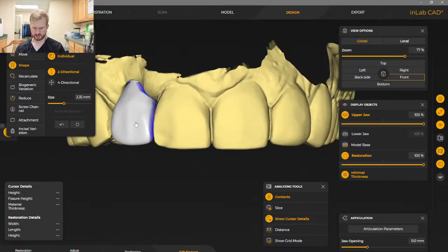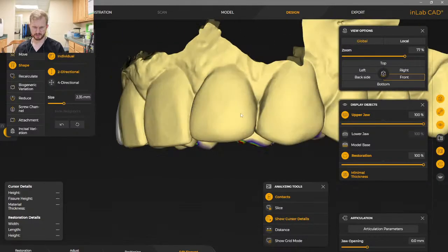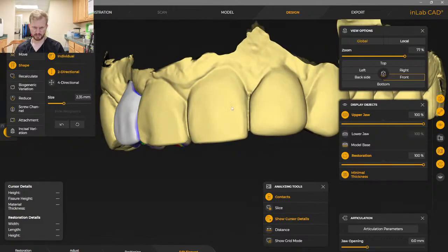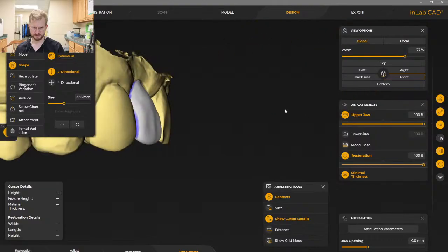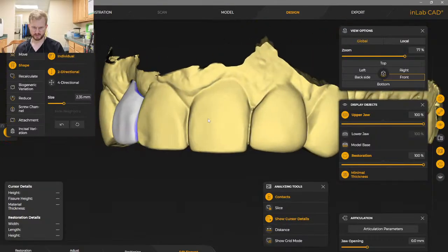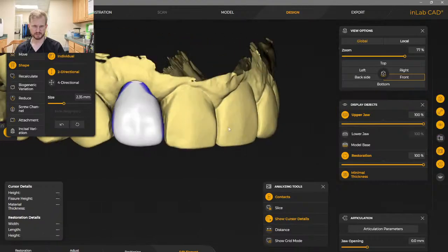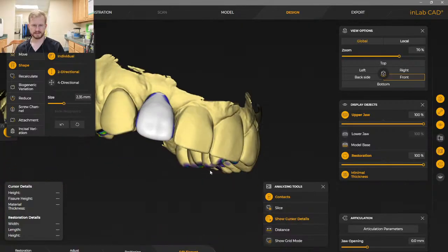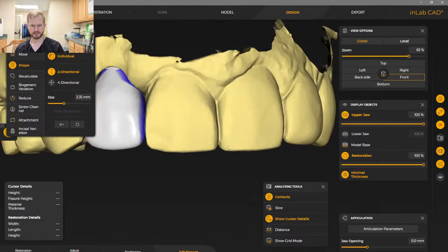I don't so much love it compared to the other lateral. The other lateral looks a little blocky to me, but these central incisors have lots of anatomy. So that's what I'm gonna go for. I want it to look more like these centrals since that's what it's next to. I think that will look better. I hate giving patients blocky bubble teeth. We're not gonna put chiclets in someone's mouth. We're gonna make it look good.